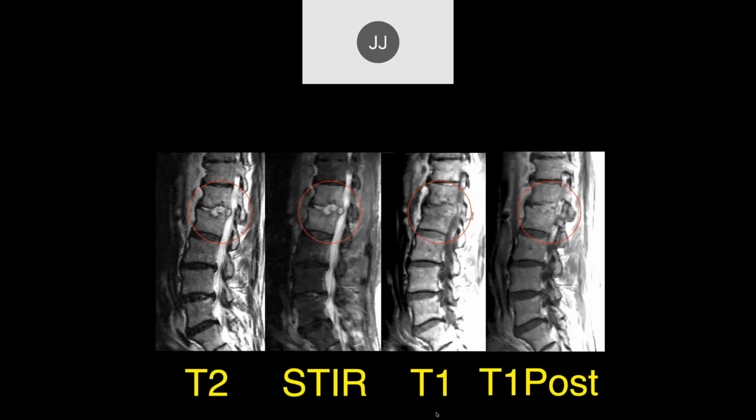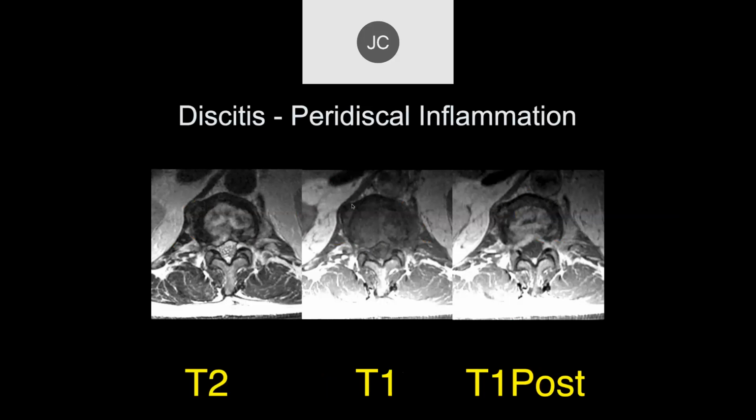Right. And then here we can also see discitis, more of a chronic discitis in this particular patient. And this is a previously treated discitis, and you can see just some residual inflammatory disease.